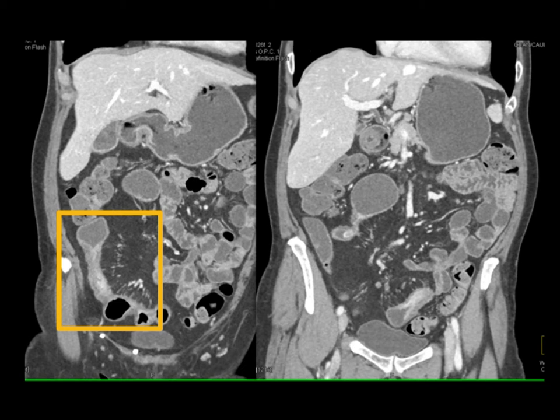On the coronal view, you really appreciate the zones of thickening of the right colon, but you also see that area of transition of the small bowel where there's focally dilated bowel and there's transition present. This is great for Crohn's disease. Yes, I could not exclude a carcinoma superimposed within these areas of Crohn's. You also see the fibrofatty proliferation.